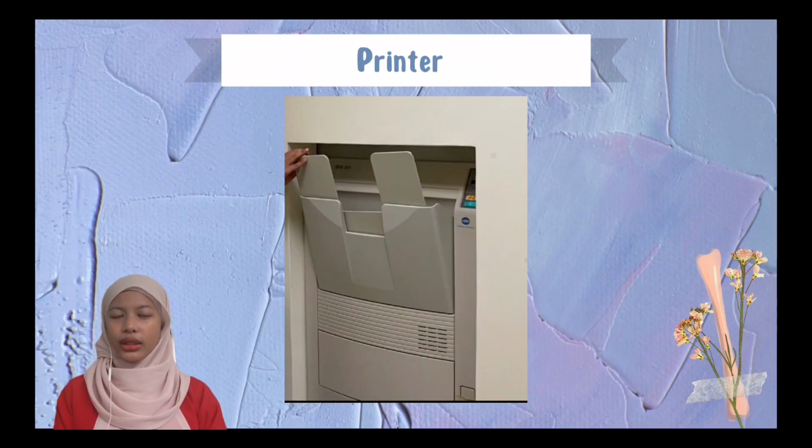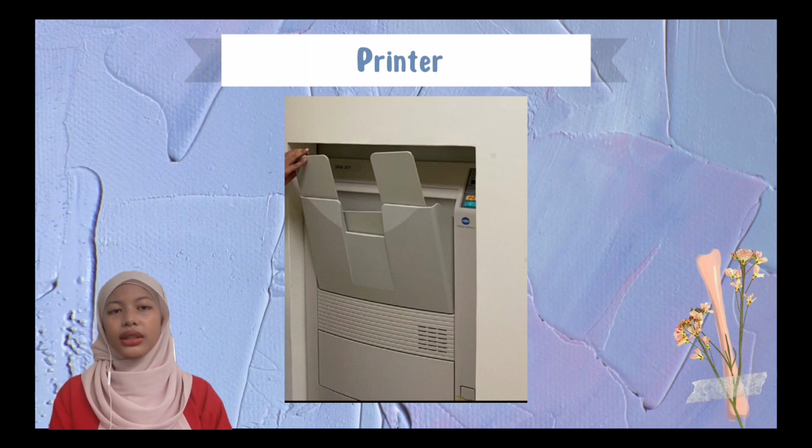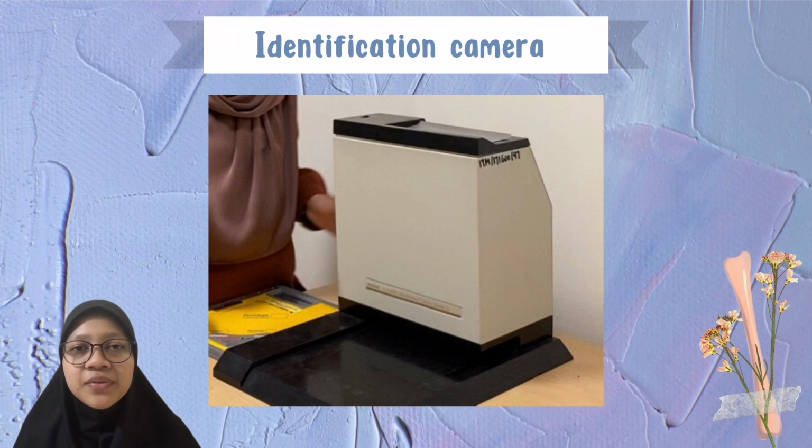Next, what is the use of the printer? The printer is used to print the radiographic image on the films. Next is the identification camera. The identification camera is used to print out the patient's name and also the patient's ID on the X-ray film. This will help the radiographer to identify whose X-ray film it belongs to.